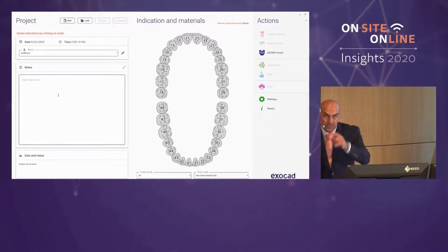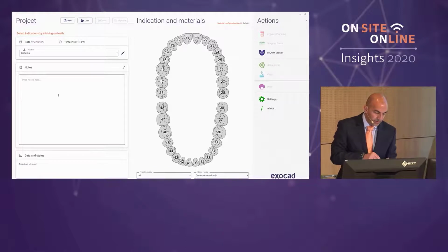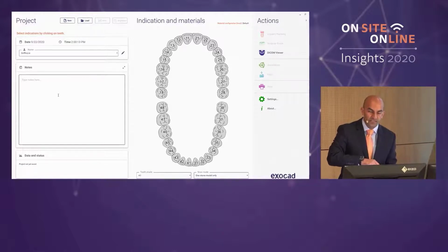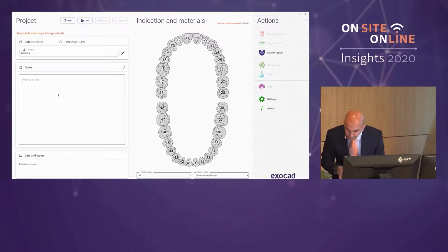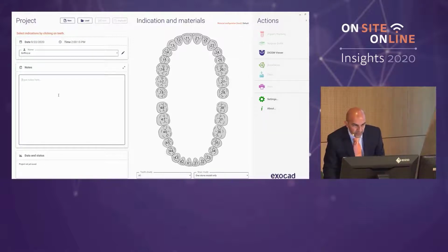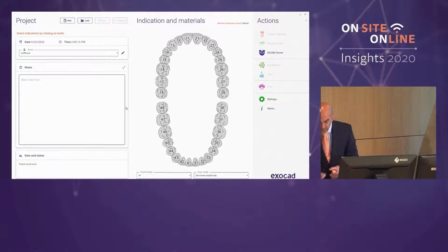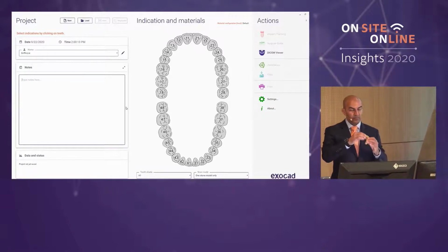So as I said to my colleague over there, we are going to use the same case, real life data now, and you'll see why her implant was deep, because we're going to bring in her CT scan and we're going to look at how we use the Exoplan platform to go ahead and design this case for predictability. That's really important. That's why we're doing this kind of digital dentistry when it comes to implants.